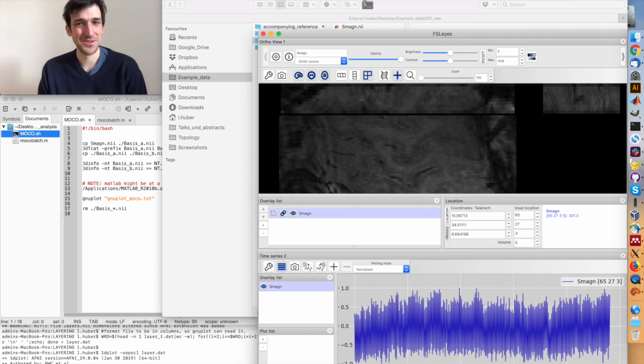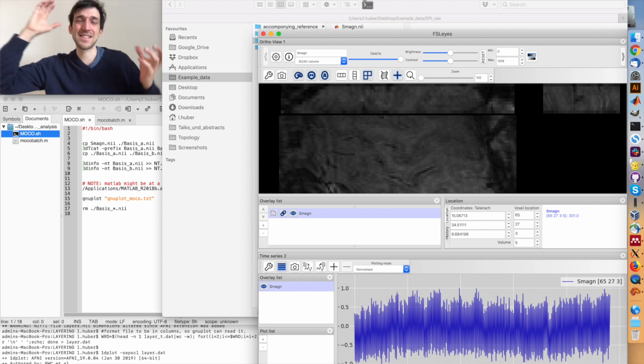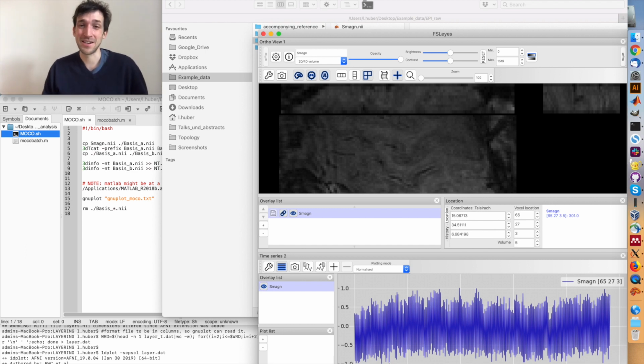The first thing that we need to do is the motion correction. With these very high resolution data, like this one here, we are always suffering from the fact that we need to use very low bandwidth. So we have problems that the brain is not really moving as a rigid body, but there are these nonlinear effects such as time varying distortions. So it makes sense to do the motion correction based on a specific ROI only. For example, only based on the motor cortex that we care about here. For that, we need a manually selected area, like a mask, and let's draw this.